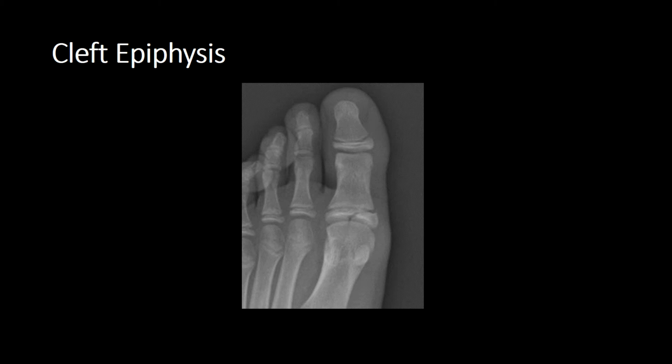However, sometimes if the site of pain is in the same location, you need to have a follow-up image to be able to identify if it's a fracture, because then it would demonstrate callus formation indicating healing, and if the follow-up image demonstrated no callus formation, that would indicate that this is just a cleft epiphysis.